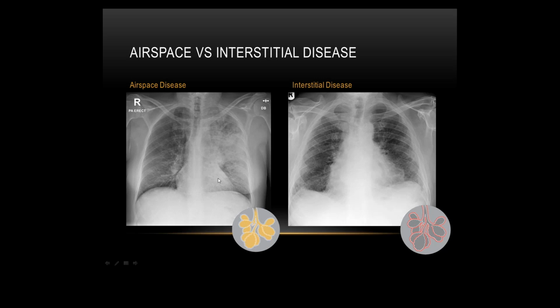So also what you can see is bronchograms sometimes, which you can see on here. Think about it: the alveoli are filled with material, which means there's no gaseous exchange occurring. As we take a chest X-ray in inspiration, the bronchi and bronchioles expand with air, but it's not going to escape anywhere because they're holding inspiration. What you see is the tracks of air through areas of dense consolidation. Have you ever seen anything like that on a chest X-ray? It looks like tram lines through a dense white-out.